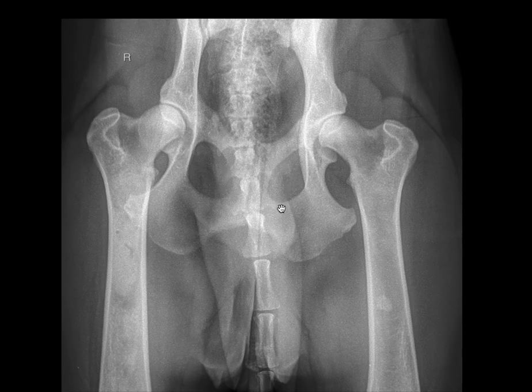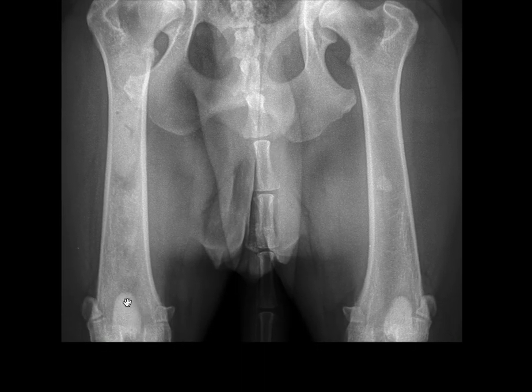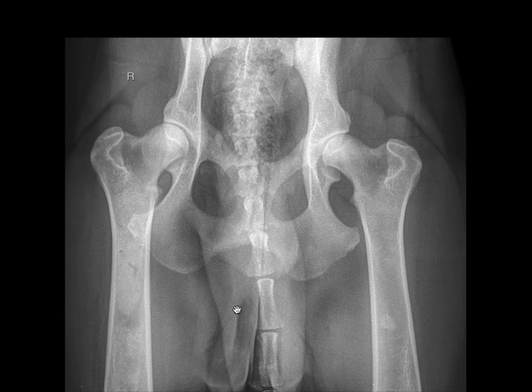When I look at the obturator foramen, I can see that the right one is larger than the left, and that tells me that the pelvis is obliqued. The positioning of the femurs is very good in this case. You can see that they're parallel to each other, and that when we look distally, the patella are relatively centered, although more so on the right than the left. So overall, given some minor limitations of assessment, I would say that the hip appearance is adequate, especially given the breed.